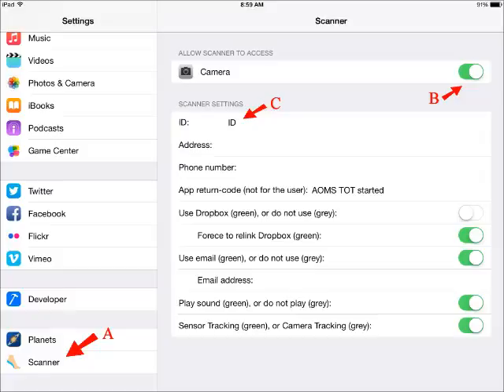With the app, you can use email attachment to send files. Without it, the app still functions. If you want to use email, you need to provide an email address. It can be your email address or the lab's email address. The app plays sound for certain actions. The user will soon have a feeling about the meanings. The sound helps the user to understand what is going on. You can leave the sound on or off.